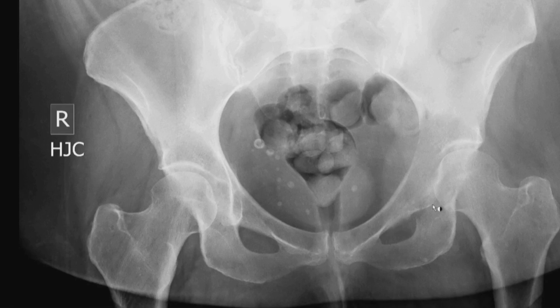So the 6 lines of the acetabulum should be scrutinized on all pelvic radiographs. We have the anterior wall, the posterior wall, the iliopectineal, and the ilioischial lines, as well as the acetabular roof and the acetabular teardrop. In this case, the ilioischial line, as well as the medial wall of the acetabulum, are both absent. Usually we assess these lines to assess for fractures, but in this case it picked up a tumor as well.